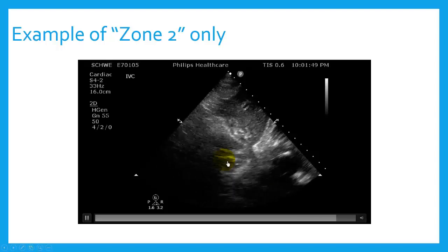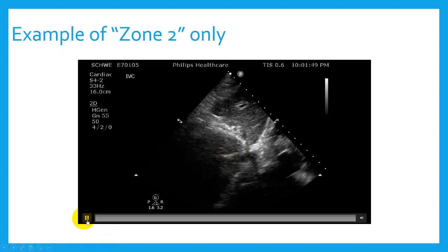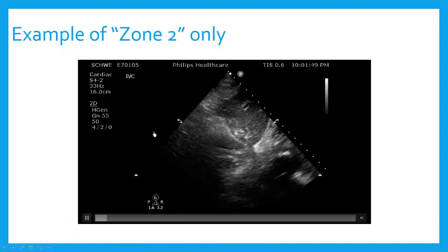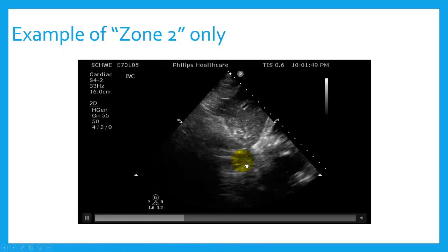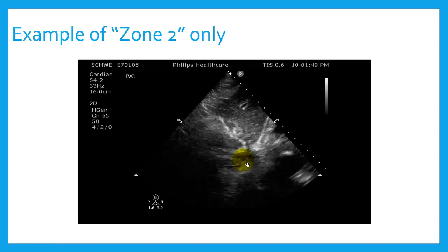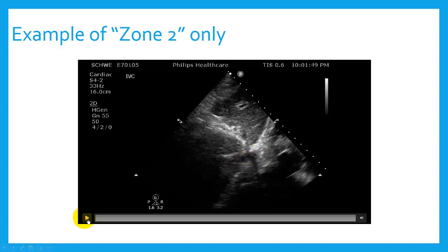When we finally did, we saw that it was just completely collapsed. So this patient was stuck in zone 2 physiology, where the abdominal pressure and the closing pressure of the IVC were prohibiting further venous return from the periphery. So this patient simply needed more volume back. After his dialysis session, he was too dry, went into PEA arrest because there was no venous return.